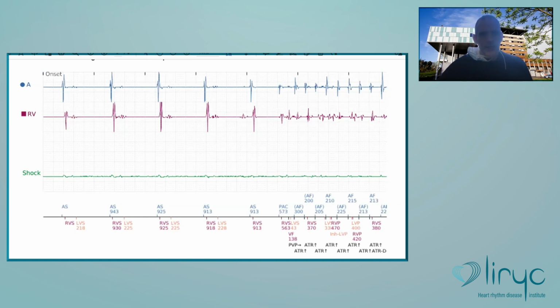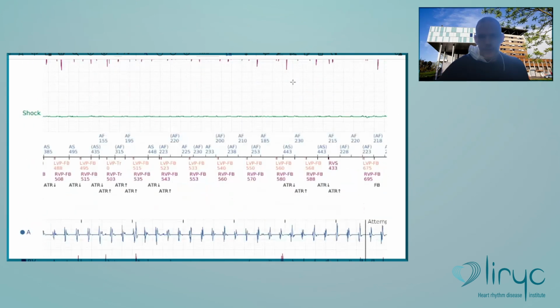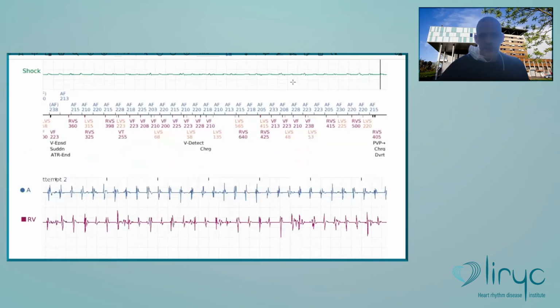And that's why, okay, there was the diagnosis in the chats, but yes, that's the dislodgement of the right ventricular lead inside the right atrium. The patient is not lucky, but at this time there is a real episode of atrial fibrillation, and therefore oversensing, and then the shock is delivered, and at the end of the shock, no more atrial fibrillation, reduction of the arrhythmia.